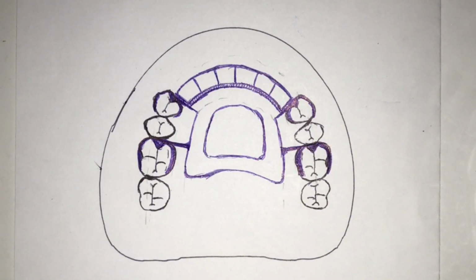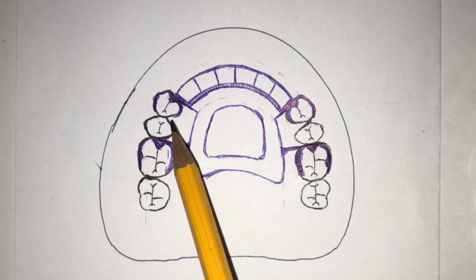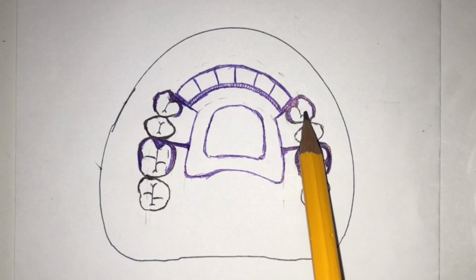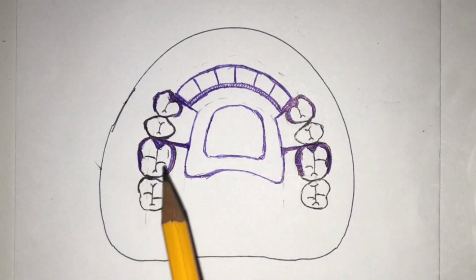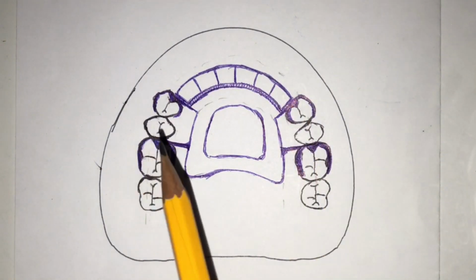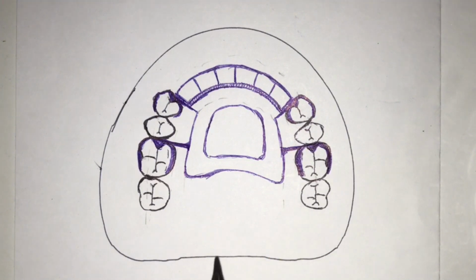So this is one of the most basic. Just clasp the premolars and then clasp the first molars. Of course, among all of the dentition, it's actually the first molars that provide maximum strength in retention because it's the biggest and it can bear more load because of its configuration, especially in its root configuration. It has the greatest periodontal support, if not compromised.